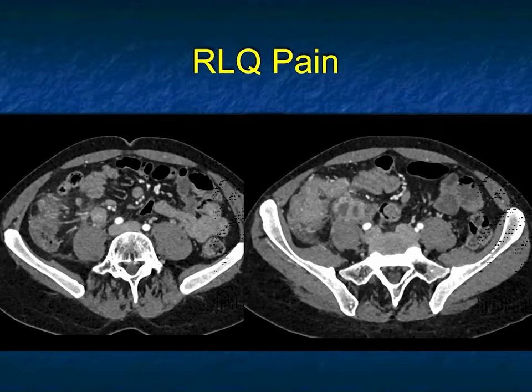We mentioned that all of the time. Nodes, involvement of ileum, involvement of the right colon, including cecum. We also could think of inflammatory disease. Could this be Crohn's disease? Crohn's commonly involves the terminal ileum and can extend into the cecum and ileocecal valve. But again, Crohn's is usually more of narrowing. Here it looks more mass-like. I did see a case recently that was IgG4 disease, which looked like a malignancy. So if everything else was negative, I might consider IgG4 disease.